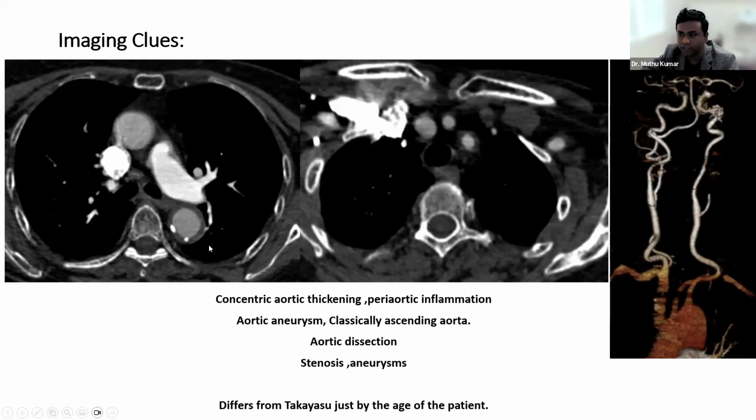If you don't have the age, look for presence of calcification. If there is calcification, sure, the patient might be older in age. Look for any other signs of atherosclerosis. If you don't have any clue, just go and ask the tech, what is the age of the patient?